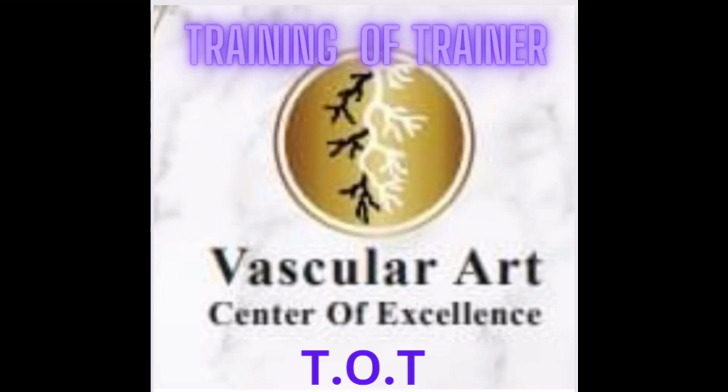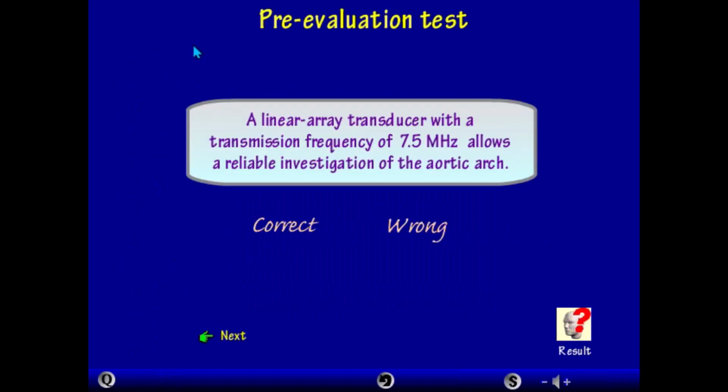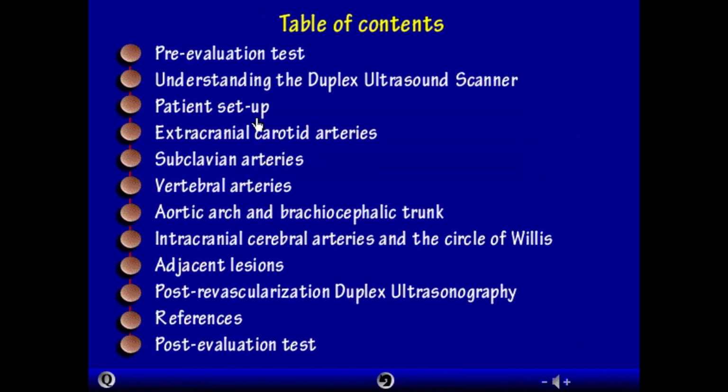Can you learn vascular duplex scan from computer software? Actually, yes. This is a CD program which teaches how to do carotid duplex scan. I will share with you. First, it will give you some questions to answer as a pre-course assessment. So, 7.5 megahertz, obviously it is wrong. And then you continue with the next question and it will correct your answers and give you marking.